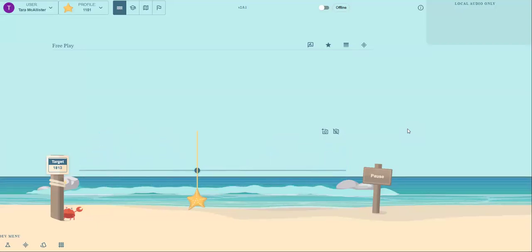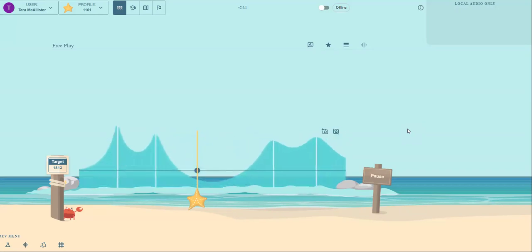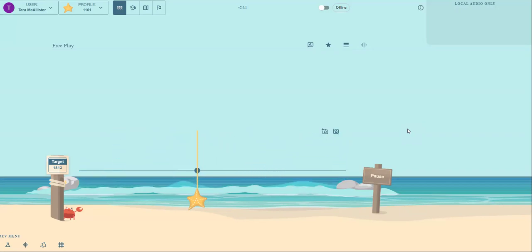ooh. Currently, staRt is targeted at children who have difficulty producing the English R sound, which looks like this. Er. Children with a distorted R sound will usually produce something like this. I'll transition between those so you can see the contrast.